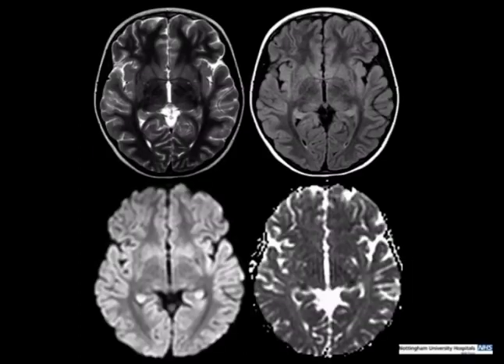Talking of seizures, given how common they are as a reason for doing imaging of the head in children, I just thought I'd show you a couple of cases that show you signal changes that are caused by seizures. So this is a 12-year-old girl with uncontrolled seizures, and these have been going on for quite a long time, so she ends up in MR maybe about 2 days later eventually.